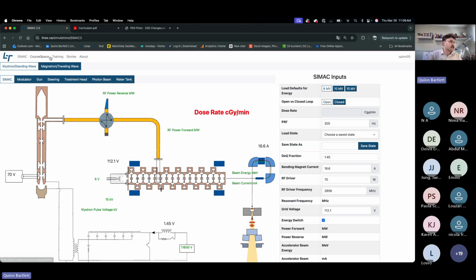The first thing I just want to show you is how we would set up a beam. And then we're going to investigate a bunch of PDDs with a bunch of different setups and look at some PDD dosimetry.